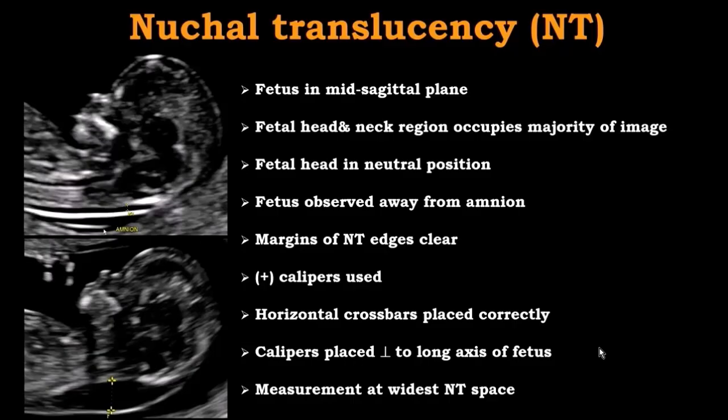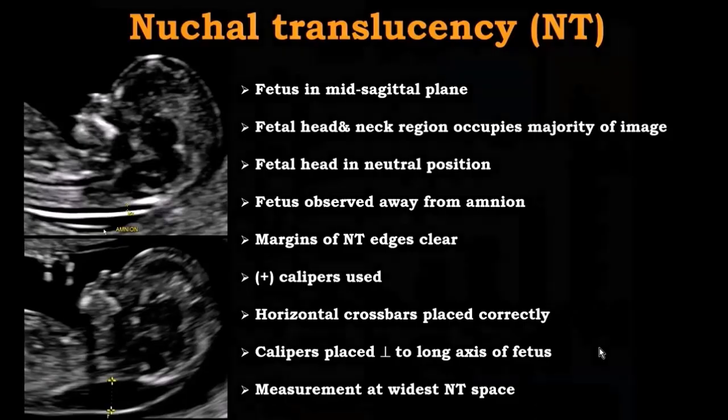Nowadays, the nuchal translucency, which was initially introduced as a screening method for chromosomal problems, in particular Down syndrome, has really lost this value to the non-invasive prenatal test. But we still feel that the nuchal translucency has value for early screening for different anomalies, and in particular the cardiac anomalies.